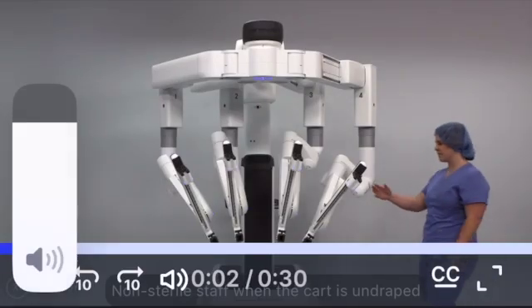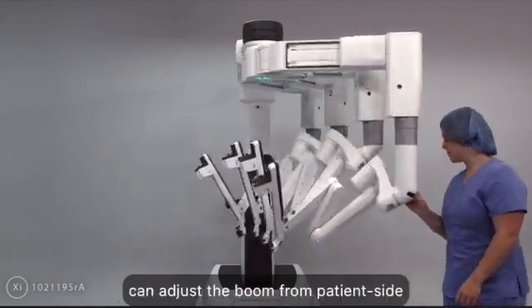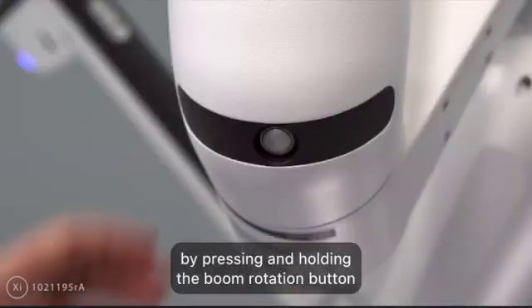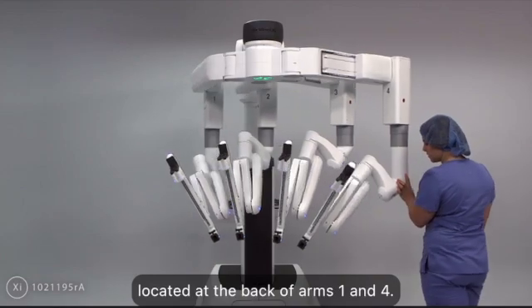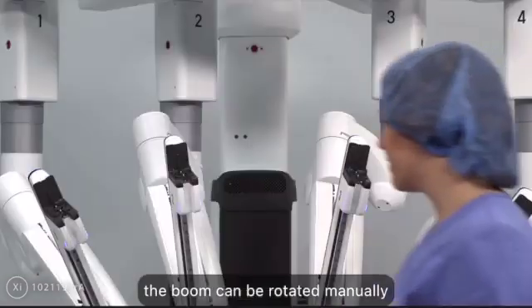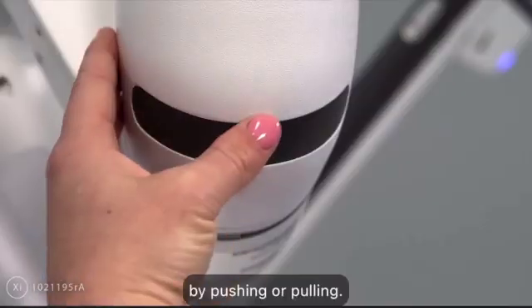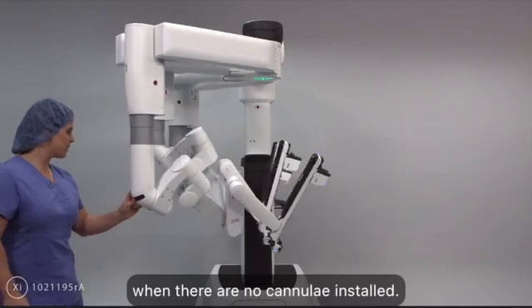Non-sterile staff when the cart is undraped and sterile staff when the cart is draped can adjust the boom from patient side by pressing and holding the boom rotation button located at the back of arms 1 and 4. Once active, the boom can be rotated manually by pushing or pulling. The boom can only be rotated when there are no cannulae installed.